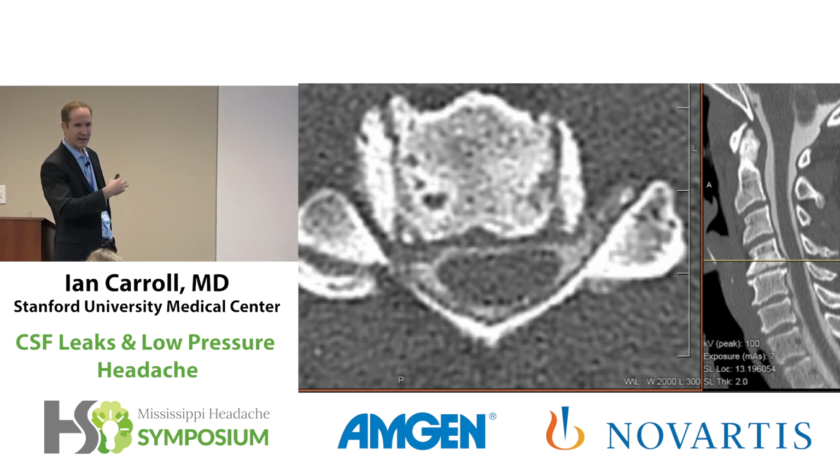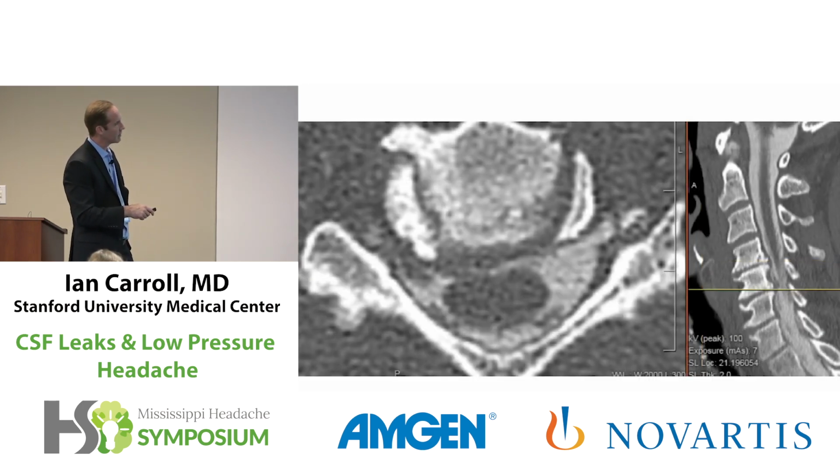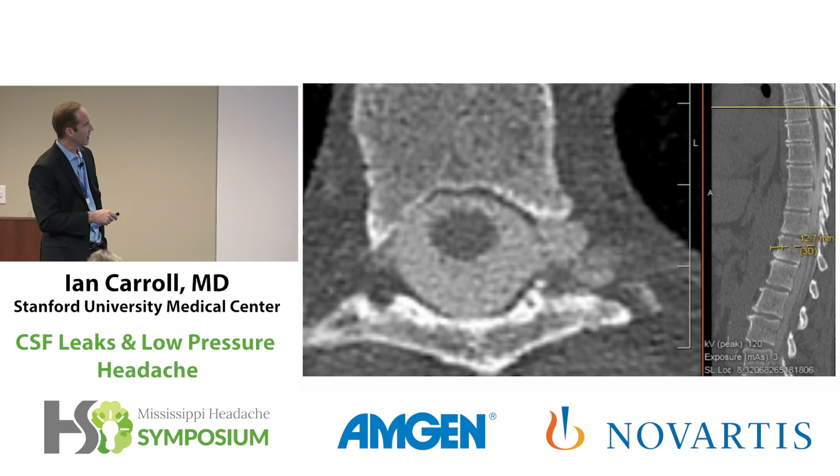and this may be an actual perineural cyst, where it's kind of a dilated aneurysm of the nerve root that has a propensity. These things have the ability to pop and leak. Unfortunately, she's got even bigger ones down in her thoracic spine. Look at this. This whole aneurysmal thing coming off the thecal sac, and then something coming off of that with even more dilute contrast here.